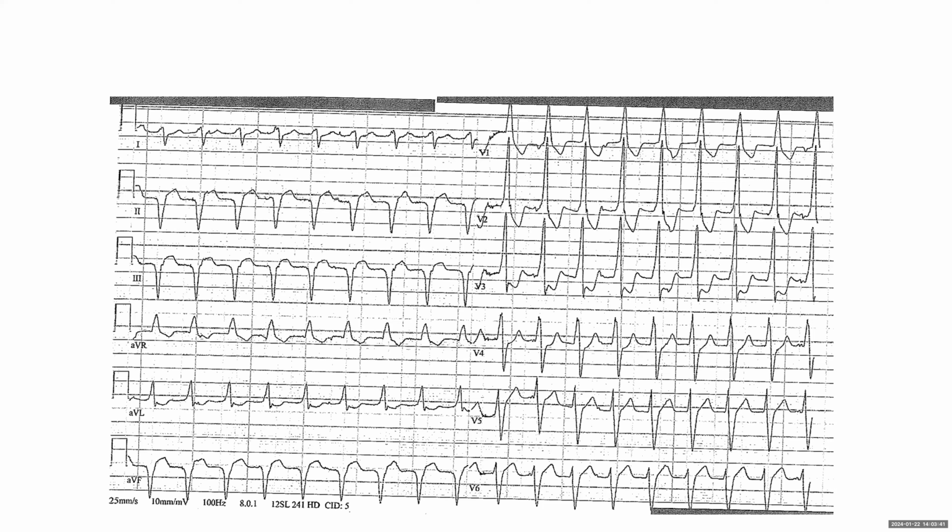What else I saw? Fascicular. It's a good thought. That's a very good thought. So Marwa is talking about a specific type of VT, fascicular VT. It could be, but probably not. Typically with fascicular VT, you have a typical right bundle morphology. Here you have monophasic R, but it could be. It's a good thought, and it's not in the coding.